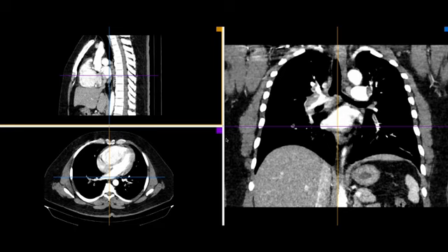This is one disease entity that affects three systems, so we'll discuss the findings under three headings: the vascular findings, the pulmonary findings, and the cardiac findings.